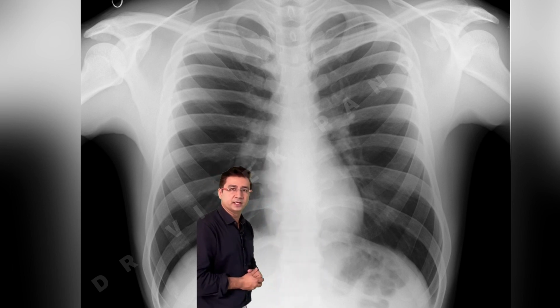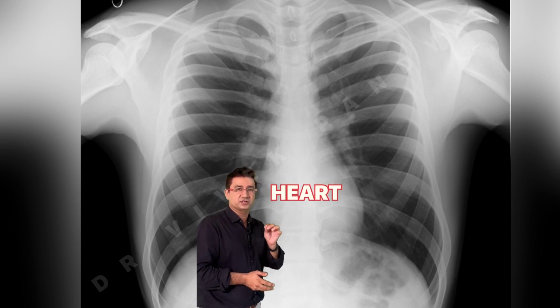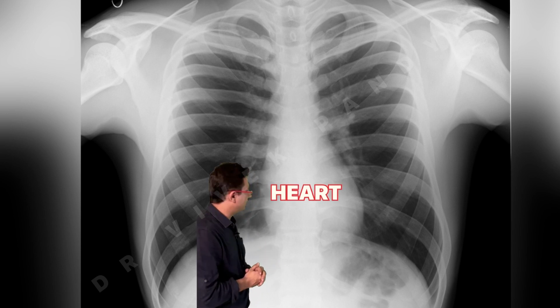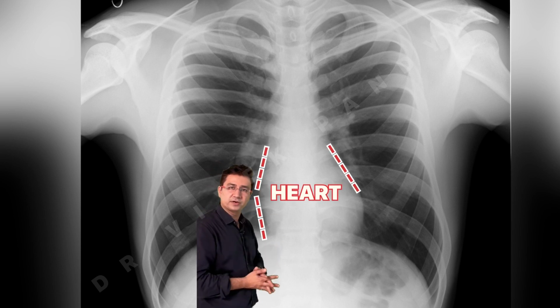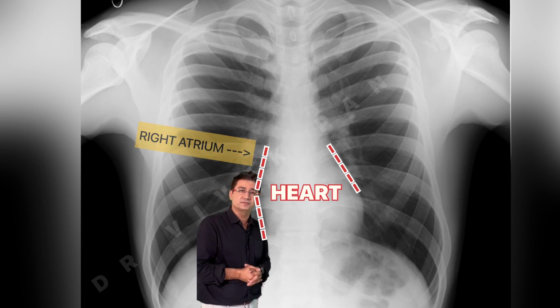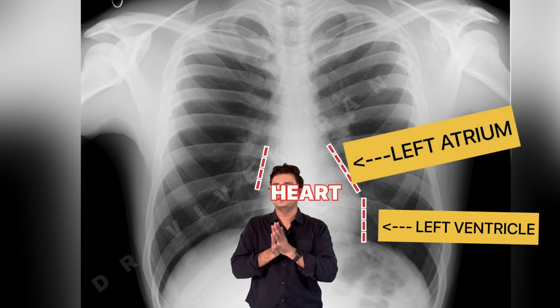In the center, the pear-shaped structure, which is known as a radio-opaque structure in medical terms, is the heart. The heart has a left and right border. The right border is mainly formed by the right atrium, and the left heart border is mainly formed by the left atrium and left ventricle.